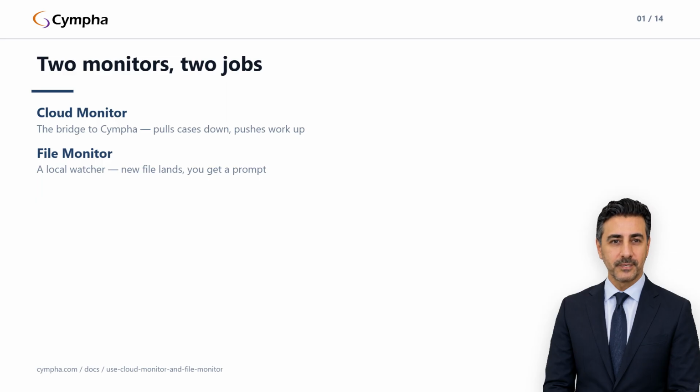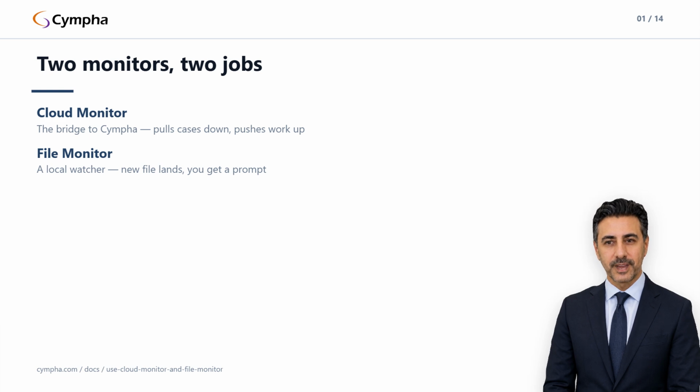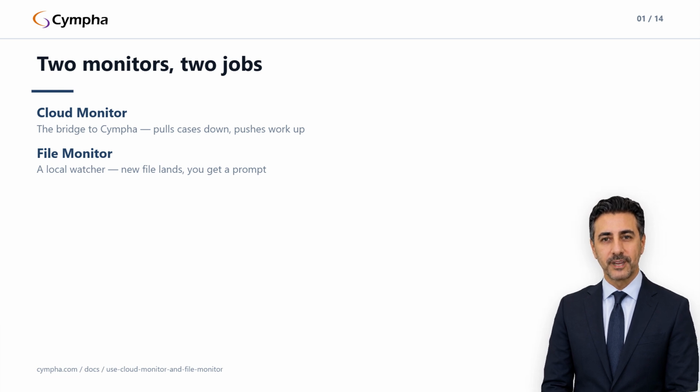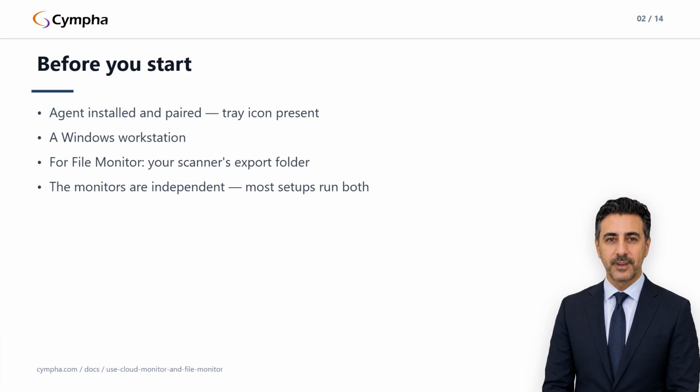The prerequisites are short. You need the Agent Manager installed and paired, tray icon visible, tooltip reading Cympha Agent Manager. If you're not there yet, the Install and Pair lecture is the place to start. You need a Windows workstation, since the agent is Windows only. And for File Monitor specifically, you need to know where your scanner writes its exports, somewhere on disk where your intraoral scanner or your scan cleaning tool drops new files when a case finishes scanning.